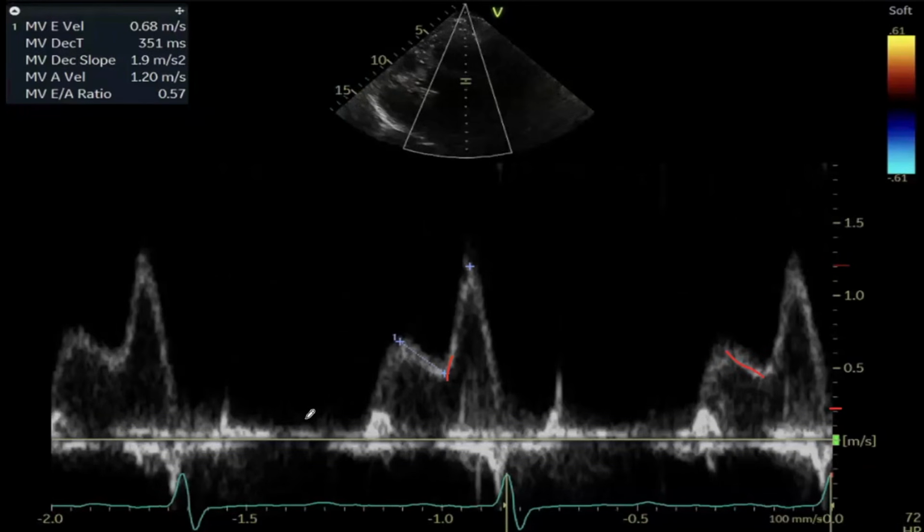Everything. I think the key here when you get this sort of spectral profile is to really go back and look: are you truly at the tips of the mitral valves, or have you gone off axis to look at the flow, as Yazeed said, which tends to come out and go along the lateral wall? Although the spectral profile here is pretty clean, so you would say probably it is good.